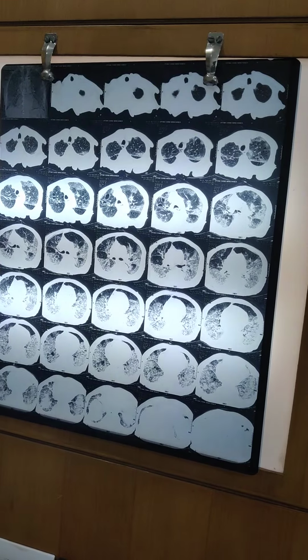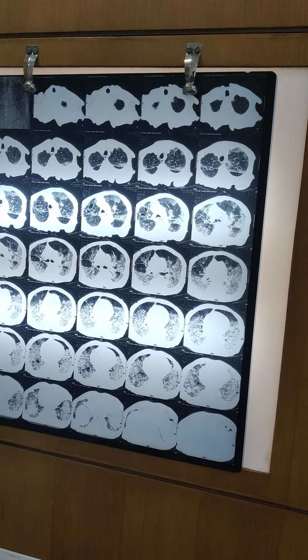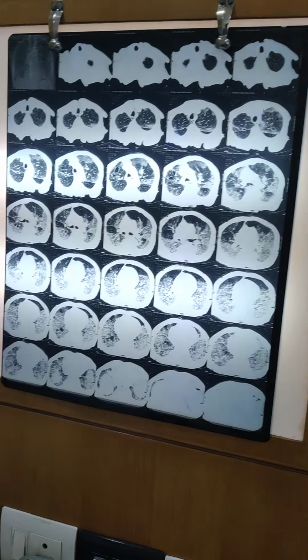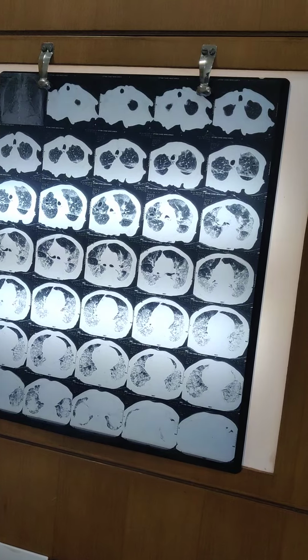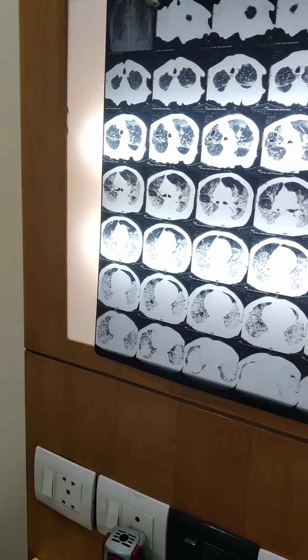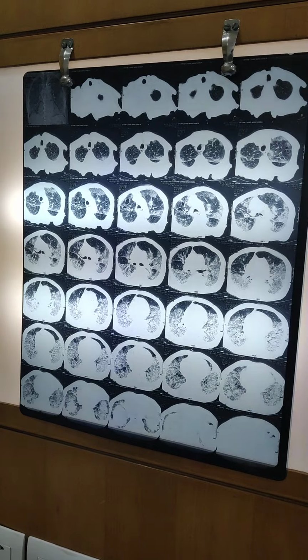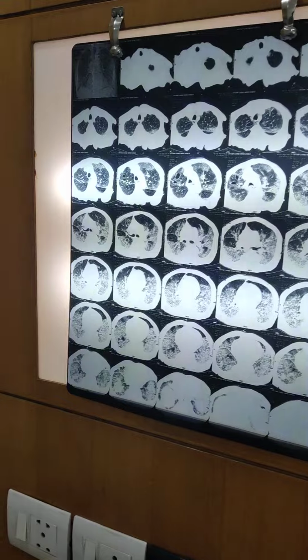The reason I wanted to show you is that whenever you have this kind of CT with a patient presenting with fever and RT-PCR positive, always get the markers done, and usually they should be given a very aggressive steroidal approach. And you see, it's like totally flared. It's like a forest fire. It's like totally flaring up. So these are the things you should always be careful about. And this patient is in ICU 4, and one can go and have a look. This is a very interesting presentation, and this can be asked in the exam.